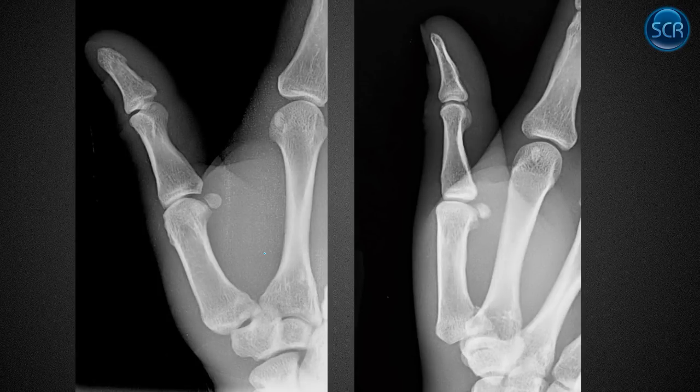All right, so what are we seeing in this case? When we're looking at thumb trauma, the 2 main things we're thinking about are gamekeeper's thumb, and that looks fine, right? This is just normal sesamoid bones. You have 2 of them. You can't really see the other one that well.